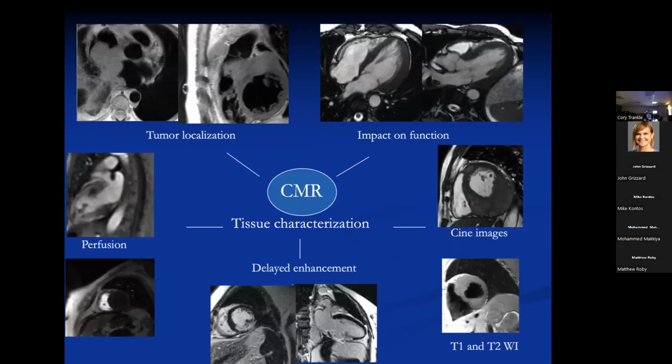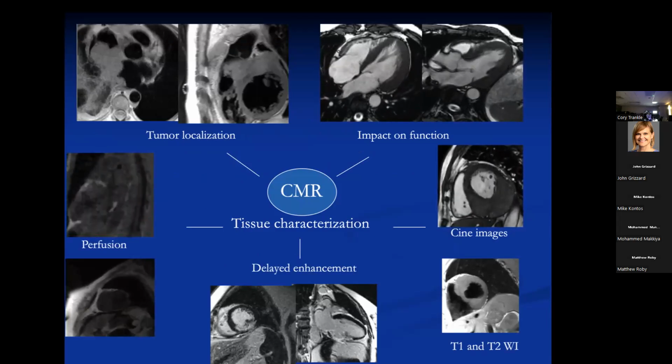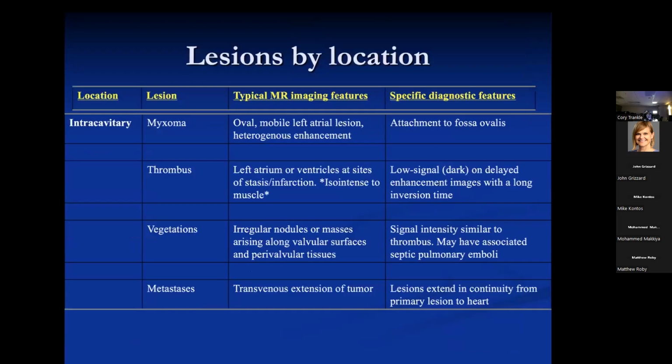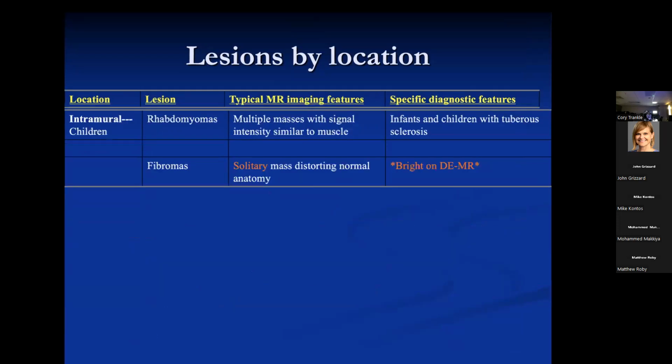But I think probably the best single sequence to evaluate tumors is the perfusion sequence, which is very helpful. I've put these in. I don't know whether we give you all handouts. When I give this lecture at some places, I'll do that, and then you have all these, but it's a lot to look at, just like this, but just the intramural.